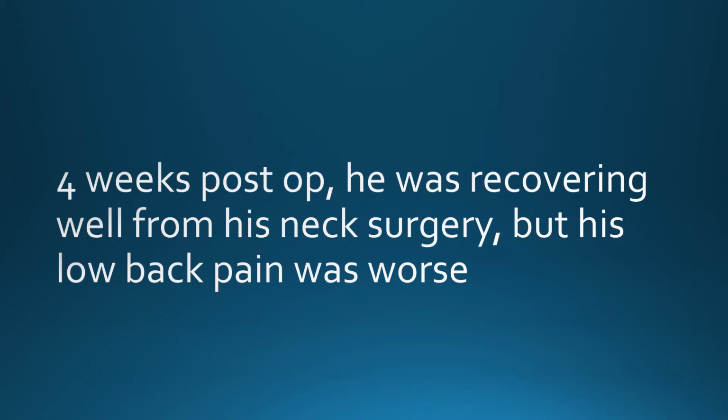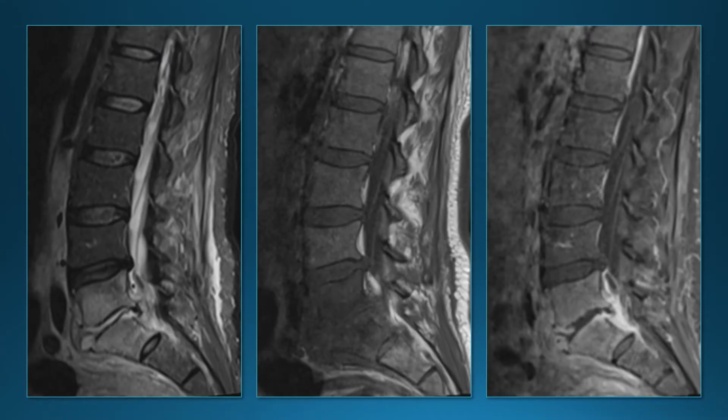Four weeks post-op, he was recovering from his neck surgery, but he came back to the office and said his low back pain was worse than it was before. At that point, he had a follow-up lumbar MRI, and here we can see on the STIR images a number of findings. Bright signal within the disc. We have abnormal bone marrow signal in the L5 and S1 vertebrae.